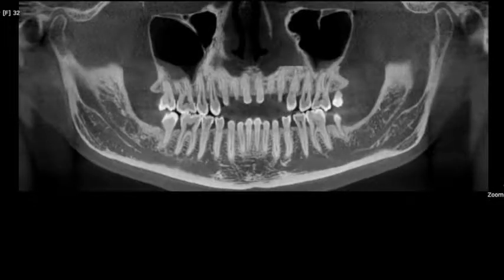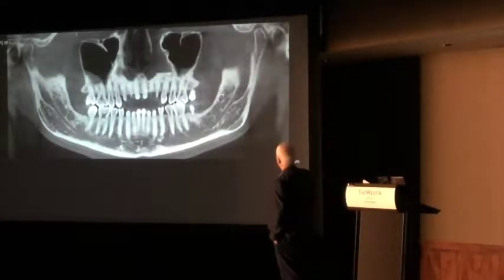But I want you to look at this. This still looks like a kind of a panoramic, and none of these teeth are missing. This is at 1/10 of a millimeter. Well, why wouldn't we use an image like this to look for those small, quote, cavitational areas, okay? And if you look at this, somebody might go in there. Somebody might look here and go, oh, maybe I'll go in.